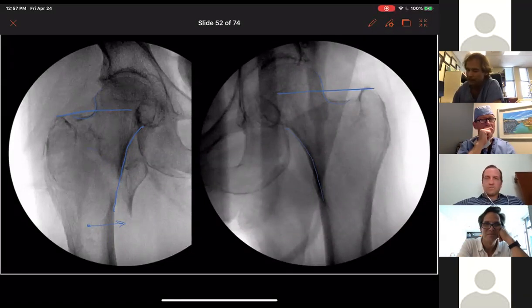I saw this gap too as a problem, but I figured that it was either partly rotational or partly secondary to the fact the posterior medial buttress is on this lesser trochanteric fragment. And so that's not there anyway. So I thought what I really needed to do was change that. Now, I may be wrong, but that's what I was thinking.